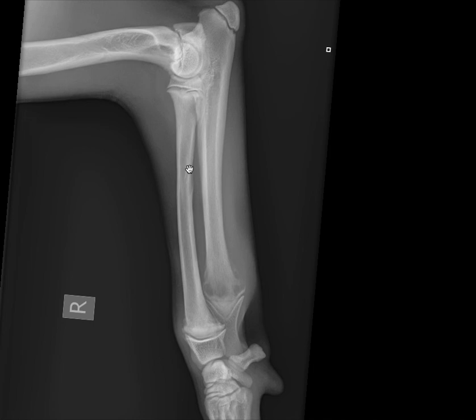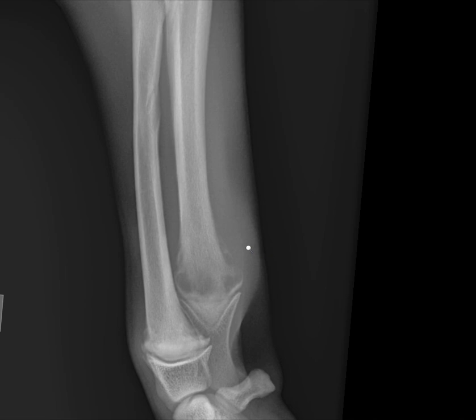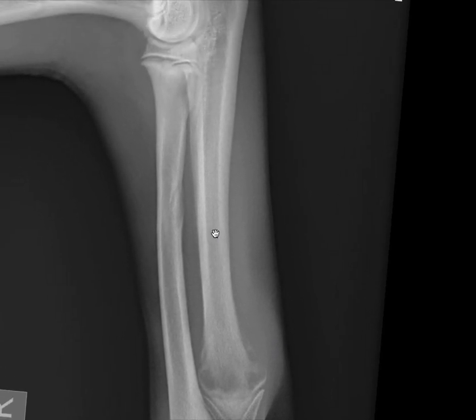A for alignment is followed by B for bone. This is where, of course, we spend a lot of our time when we're doing the ABCDs approach. When I'm doing B for bone, I trace the medullary cavity and the cortices of all bones on all views. While we're talking about that, I'll take a moment to note a minor and potentially questionable finding in this case.